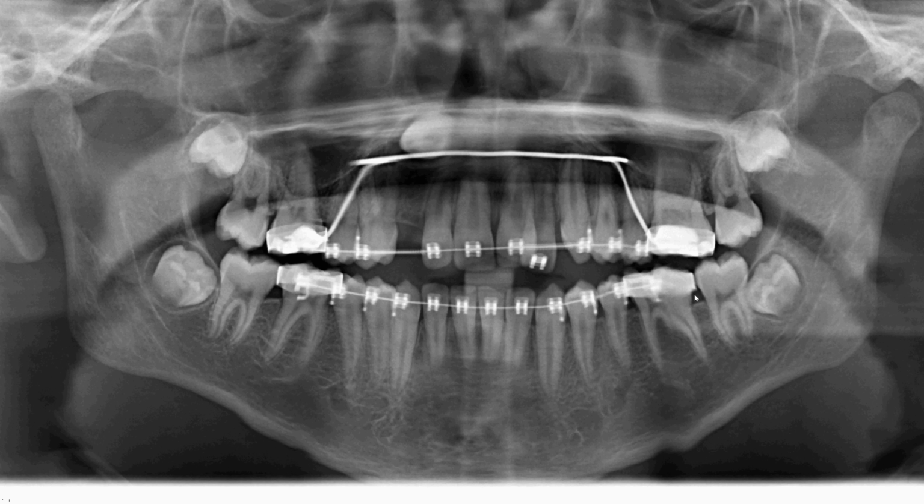If this side is widened as a result of rotation, I would expect the second molar and third molar as well as the width of the ramus to be wide as well. However, that's not the case. As a matter of fact, the second molar, number 31, looks wider to me than the mesiodistal distance of number 18. So then what could possibly be the explanation of this appearance?